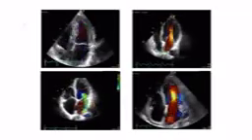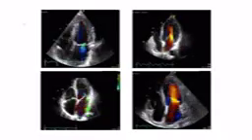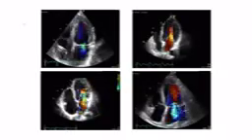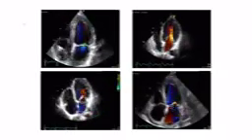This is the second example. Third example. This is a nice jet, I would say. And here is the fourth example. And here is the answer.